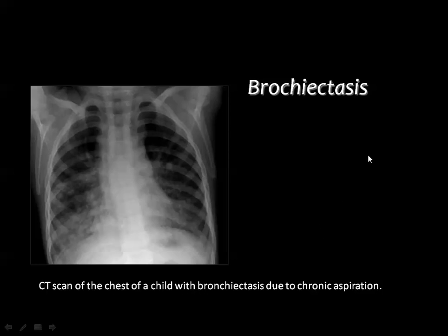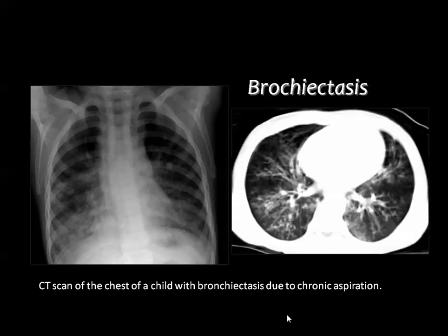Then one of the complications of pneumonia, if it persists for a long time, is the development of bronchiectasis within the underlying lung. There was a very old technique known as bronchography to confirm the diagnosis of bronchiectasis whenever it is suspected clinically.